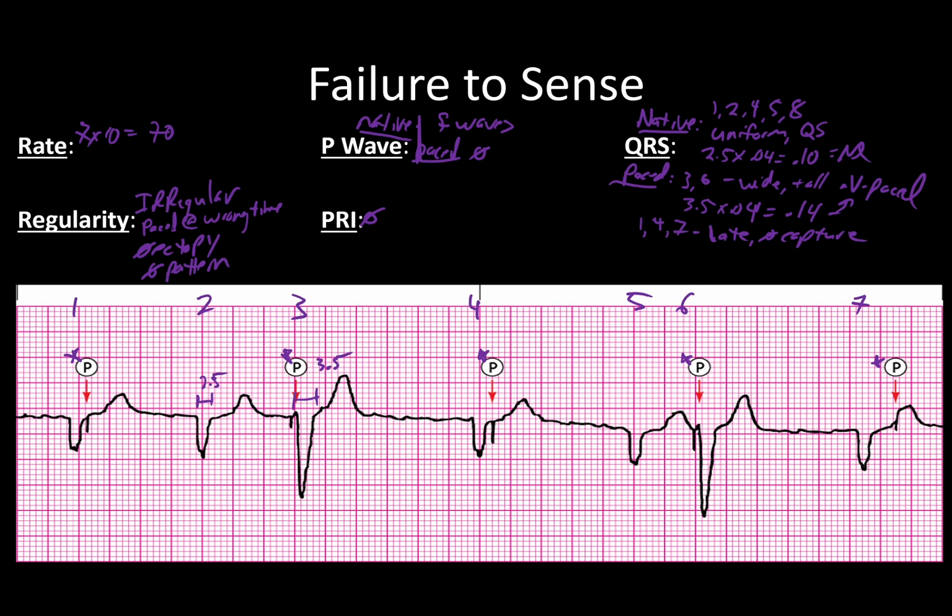And what this comes down to is, I'll just read some of my notes here to try and make sense out of it. The underlying rhythm is atrial fibrillation, and we've got V pacing. The pacing rate is set to about 45, and we can prove that by marking out this one here. We'll measure over, and we mark here, and that's about 33 small boxes.